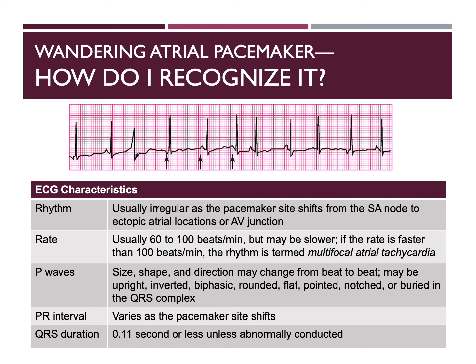That PR interval is going to vary as that pacemaker site shifts, and our QRS duration is typically going to be 0.11 seconds or less, unless there's something that's being abnormally conducted.